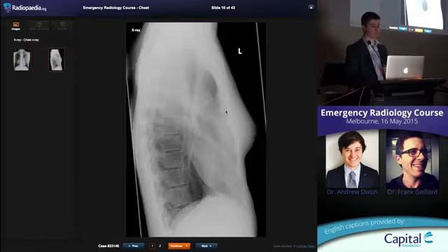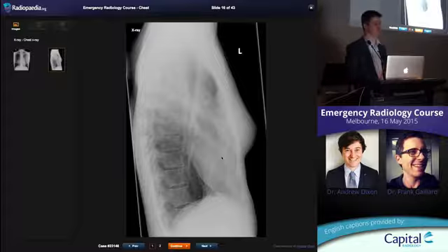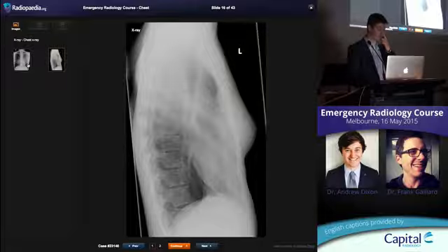On the lateral, you can see it coming in here. That's the sternum depressed inwards on this patient. So the sternum comes in and actually pushes the heart off to the side. The increased density there is because it's traversing more soft tissue because of the way in which it fills with a little bit of fat in front of their chest deformity. Okay, so that's a little trick.